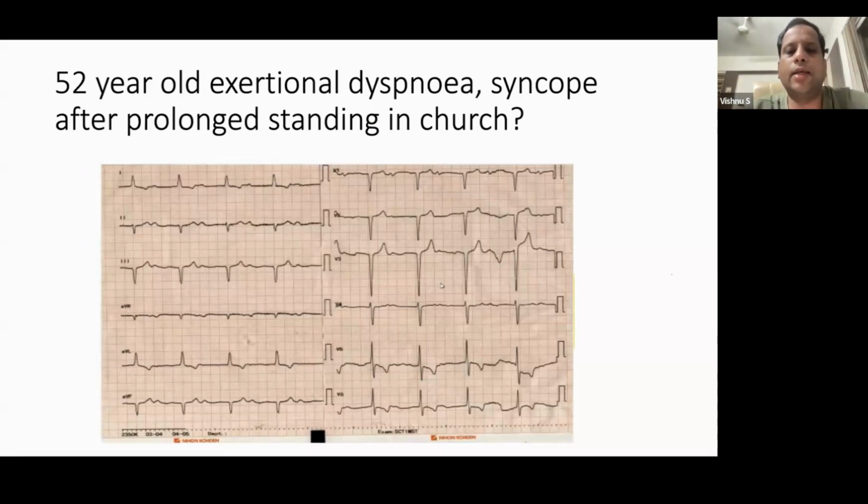This is an easy thing we usually see in daily routine. Can anyone read the ECG and tell the diagnosis? You should read the ECG: see the P wave axis mainly in 1, 2, aVR, then PR interval, QRS axis and duration, ST segment, T wave, QT interval, like that. This is the way you should read a bradycardia ECG. Of course, in the rhythm strip, we have to see all beats one by one. What is the diagnosis in this ECG? It's a very easy ECG.